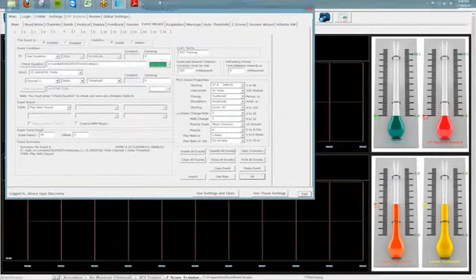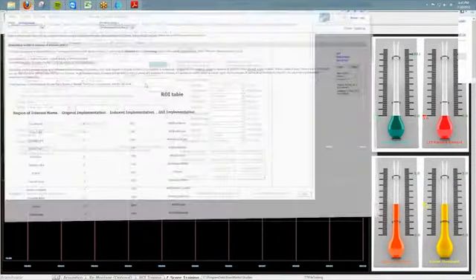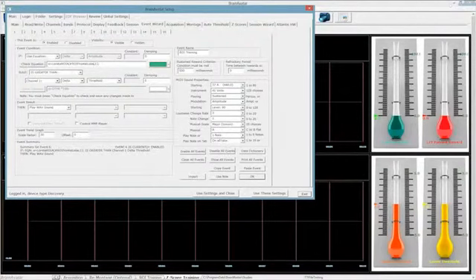Now, occasionally, that may or may not open. I think we finally fully gotten it working so that it should always pop up. But if it doesn't, you actually have this GUI implementation. So if you really wanted to use this, you can still just type it in, and it will work. So that is some of the information on there, of what's going on.